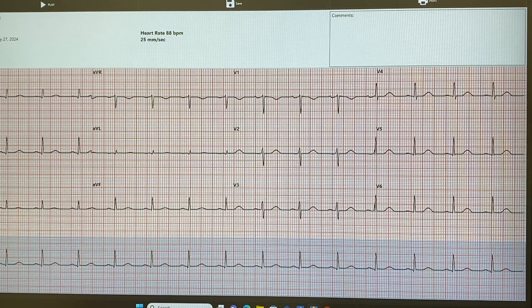And then we're looking at the PR interval, if it's normal or prolonged. And what is normal PR interval? We said it was 0.12 to 0.2. The way that I look at that is I just find a P that begins at the beginning of the square, you know, like on the line of the square. So you find one, and then I look and see where is the QRS. Does the QRS begin after that big square, or is it within that big square? And if it's within that big square, then I know that my PR interval is not prolonged, because a big square is 0.2 seconds.